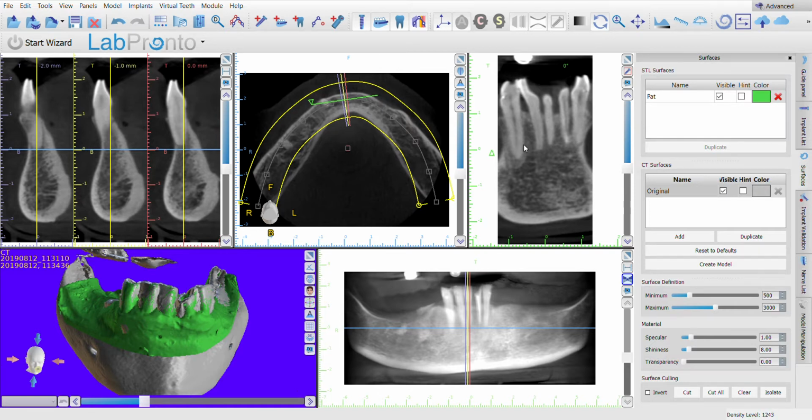And now I'm going to describe to you exactly what it is that you are looking at in any of these, and how you should be able to read these images and know exactly where you are at each moment that you're looking at this view right now. What is this view and where is it in the patient's mouth? You should be able to know exactly what you're looking at, which area of the mouth you're looking at.